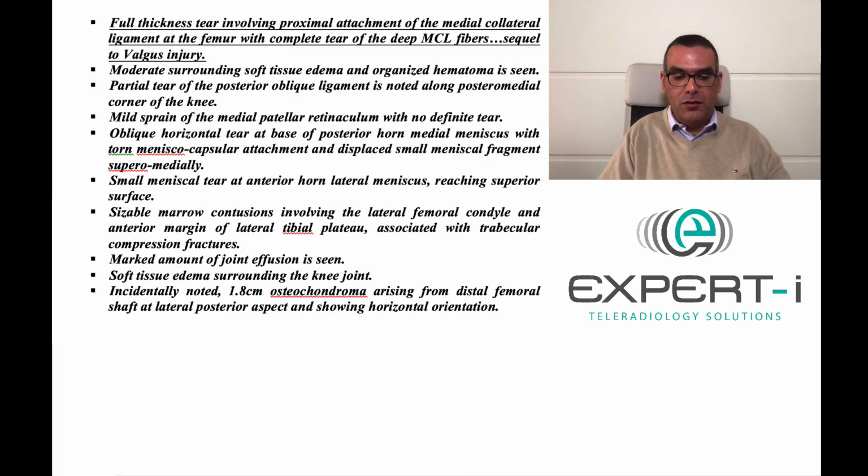Now I'm putting the report on your screen, and you can see this is just the conclusion. I'm not putting the whole report because this is just a lot of findings. The report actually was 2 full pages, and this is the conclusion. So we had a full thickness tear of the proximal attachment of the medial collateral ligament with complete tear of the deep MCL fibers, and this is sequel to valgus injury.